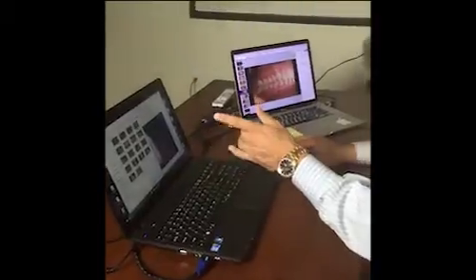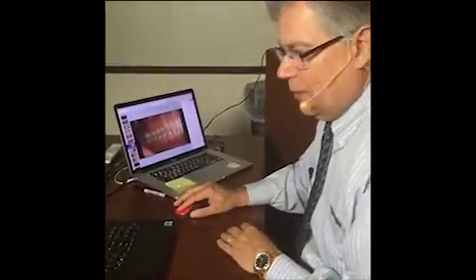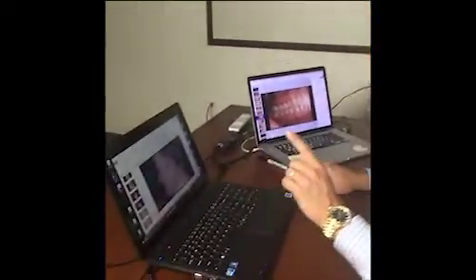And it always takes you back to the folder you were in, which actually makes this go very quickly. I'll double click and I'll put it in. Okay? That's one of the differences. Can you leave that window open so you don't have to keep going back to browse? I cannot. Not if I do it this way.